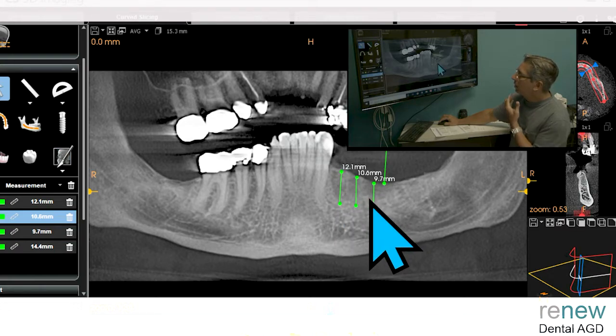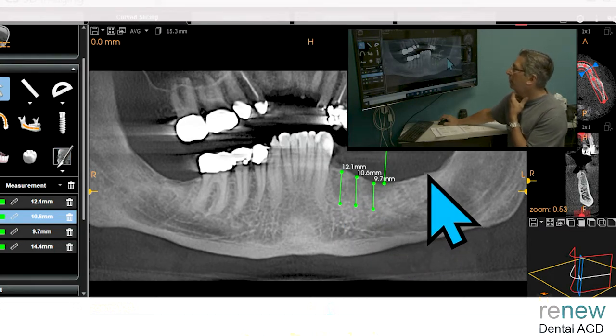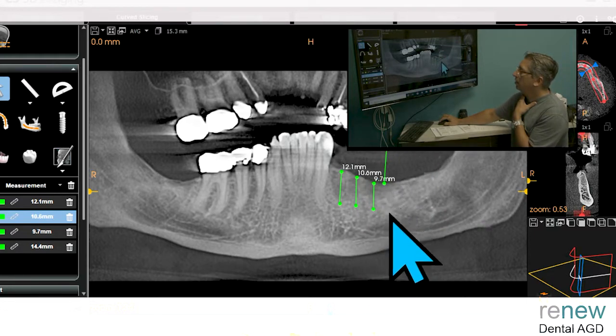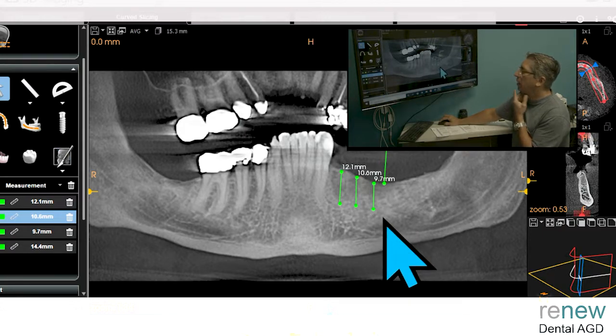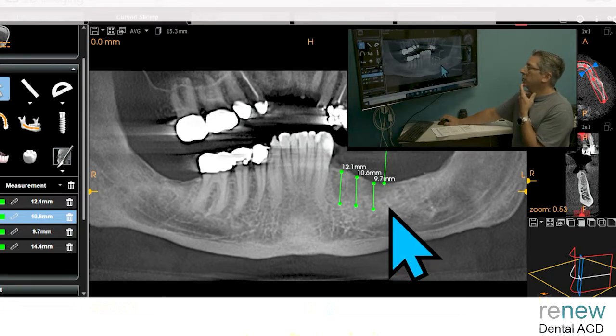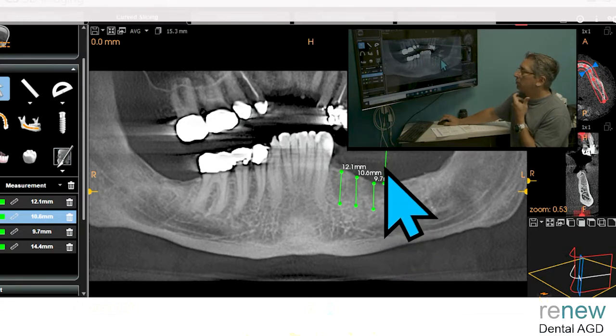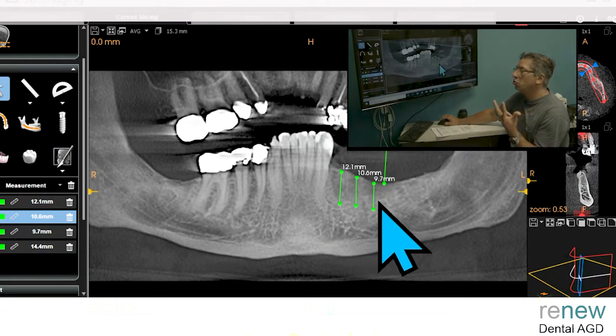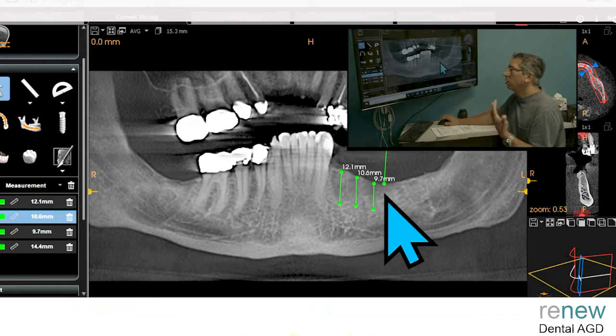If you want to spread them out a little more, that's fine, but your occlusion is going to be about 14 millimeters high, and I know you're not going to have 14 millimeters going down. You're not going to be putting in more than a 10 millimeter implant, probably in this case, at best 11 and a half. So I can already tell you probably to try to do 3 implants, then 2. 2 would probably work. It depends on how strongly the patient is biting and functioning on them.